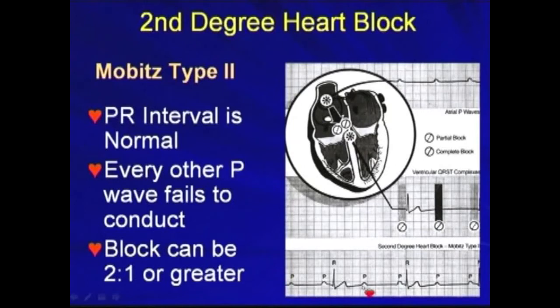So here, this P wave is not conducted. This P wave is conducted. This P wave is not conducted. This is conducted. For the conducted P wave, the PR interval is constant.